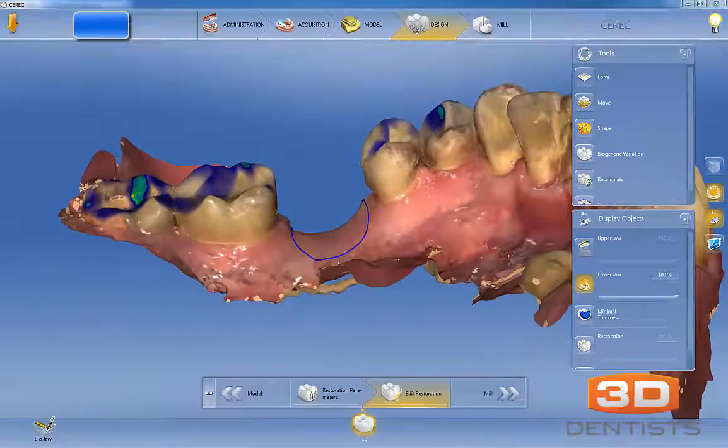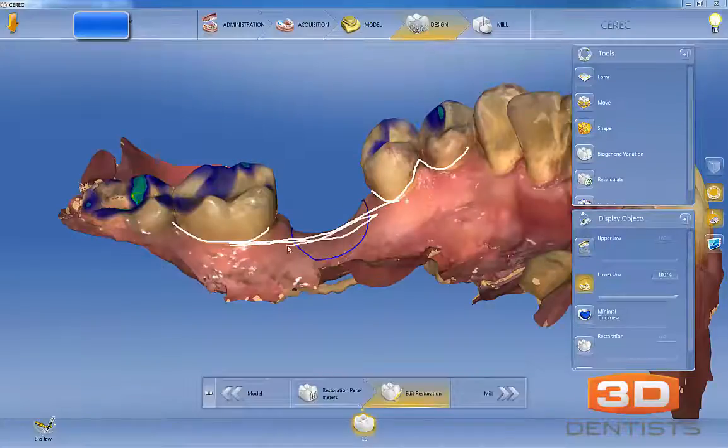And the same thing would apply here on the lingual as well. When you look at it from straight on lingual, I would mentally draw my lines like so, and I would want to see it look like so. So pretty much all of this right here needs to go away.